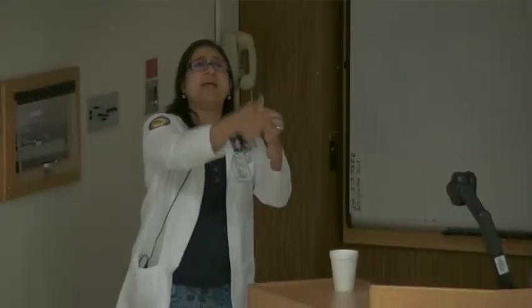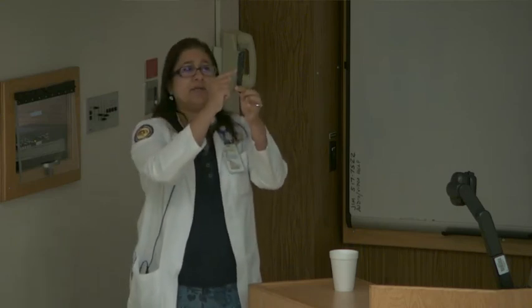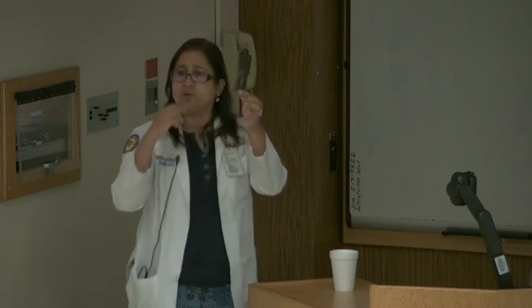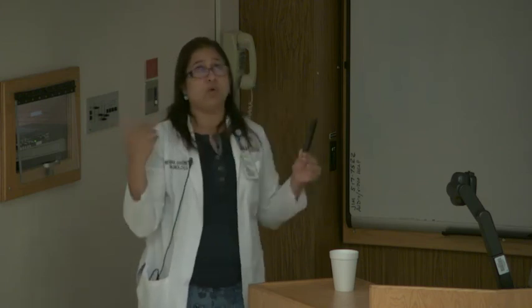So one thing to remember is, let's say this is a great saphenous vein, right? So if this is proximal, mid, and distal, if there is reflux in the mid, obviously there is reflux in the proximal, because where has the blood come from? It's come from the incompetent valve, correct? So if there is reflux in the distal, obviously there's reflux in the mid and proximal, right? So you have to tell the distal-most point along the great saphenous vein that you identified the reflux. So I can say I saw it till the distal thigh, and then what was the most severe grade? Okay, any question?